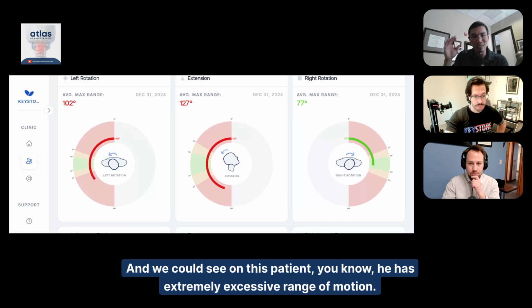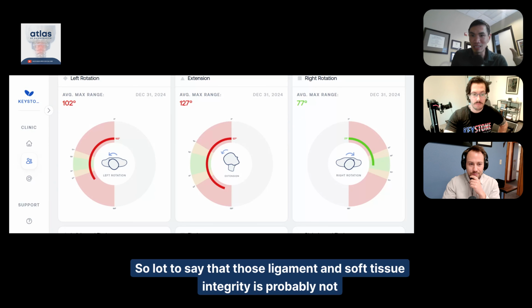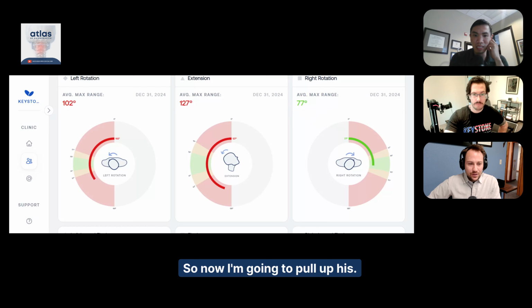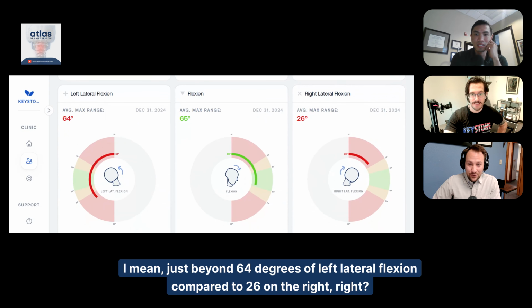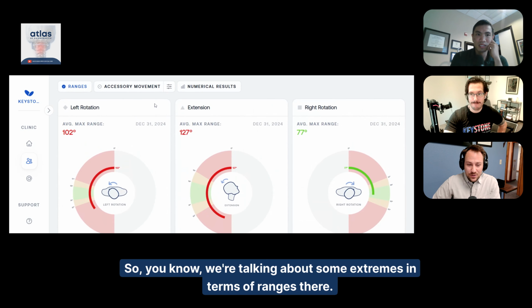And we could see on this patient, he has extremely excessive range of motion. So I would be very comfortable saying this person is very hypermobile. So it's safe to say that ligament and soft tissue integrity is probably not providing that much feedback for this particular patient. Yeah. So now I'm going to pull up his joint position error. And for the folks listening, we're looking at 102 degrees of left rotation, 127 degrees of extension. I mean, just beyond. 64 degrees of left lateral flexion compared to 26 on the right. So, we're talking about some extremes in terms of ranges there.